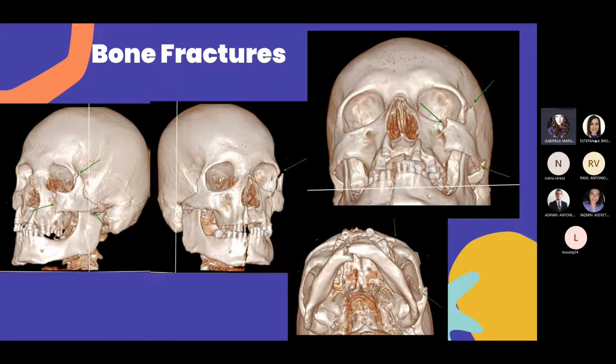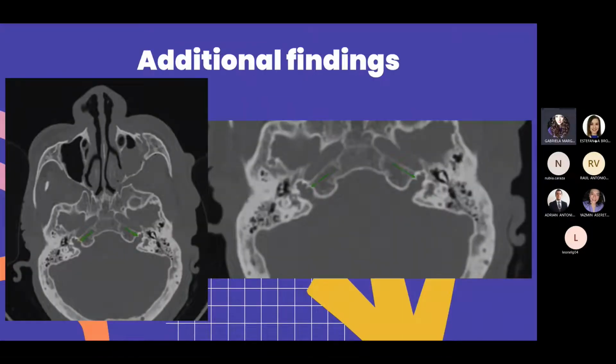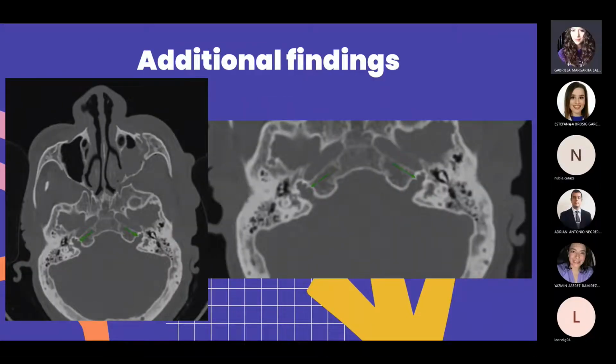But what was most interesting about this patient is that the bone CT of our patient shows a corkscrew cochlea with absent interscalar septa, and he didn't have a modiolus. The internal auditory canal was wide and it merges with the cochlea.